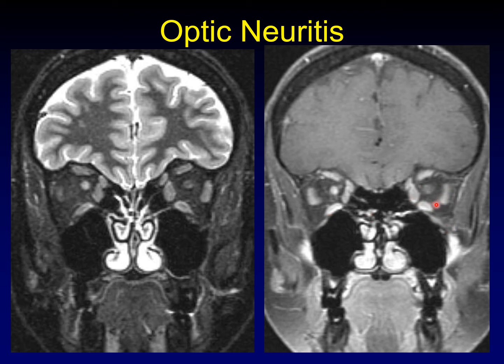This is the normal one where the optic nerve fades away, and this is abnormal where the optic nerve is enhancing. This is normal, where the optic nerve makes a target sign, and this is abnormal, where the optic nerve is whited out by edema and is indistinguishable from surrounding CSF. Actually, it has probably swollen to the point where it has displaced that surrounding CSF, but it's visually indistinguishable.